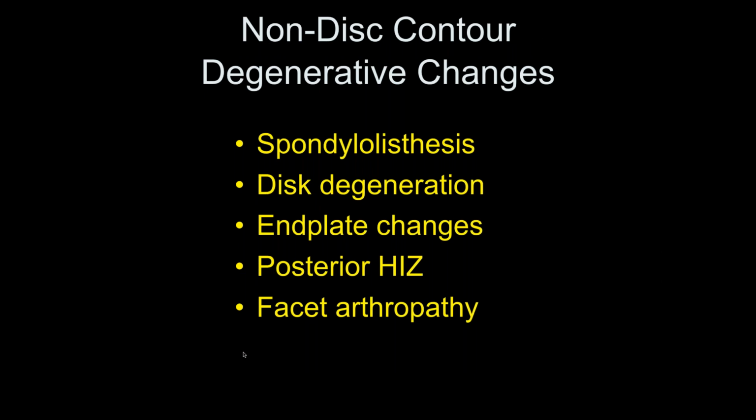But the bottom line is that we also looked at spondylolistheses, and we found no cases where the spondylolisthesis was worse in the sitting or upright position than it was in the supine. I'm sure they exist, but they're not common that you see a difference. And typically, if somebody has spondylolisthesis, it's fairly fixed. And even on flexion extension views by X-ray, we rarely see much of a shift.